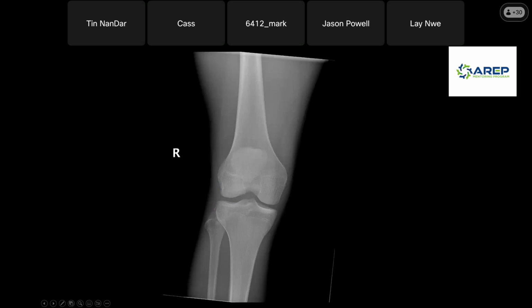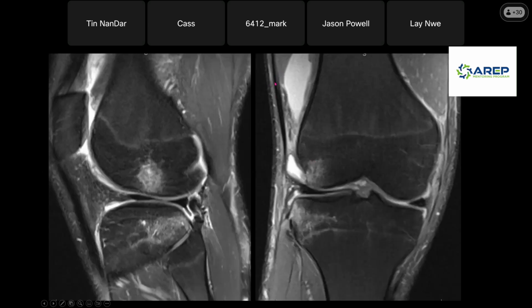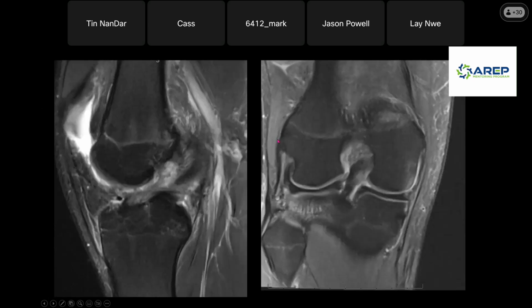Our lateral collateral structures, going from anterior to posterior, here's posterior, and we're more anterior on a coronal image. So the IT band comes down and attaches. Then directly behind that, we have the ALL that comes down and attaches. And if we go posterior to that, we have the fibular collateral ligament, which is what most people say when they say the LCL, lateral collateral ligament. That's what they're talking about, the fibular collateral.